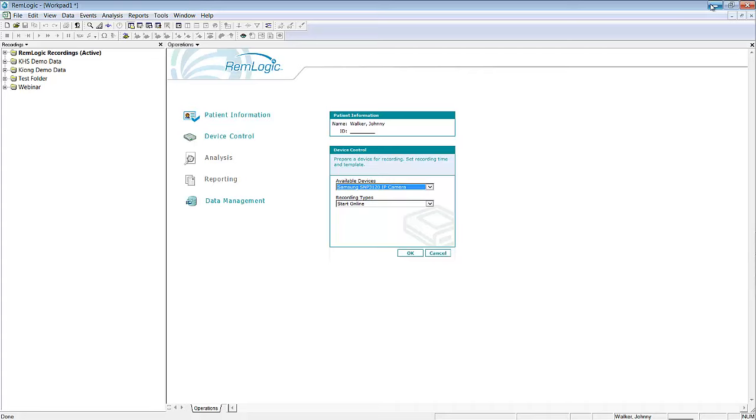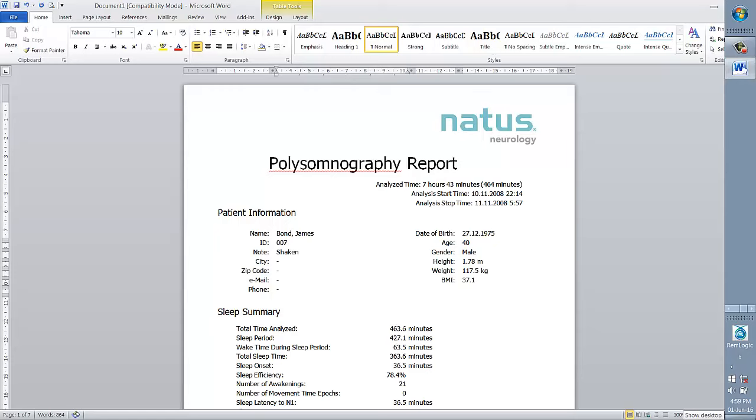So this is the generated report. Let's put a note here. Let's highlight this and save it. I'm saving it under the patient's folder. Just save it. Here it's done. If I refresh here, I can see that under documents, the report has been saved.